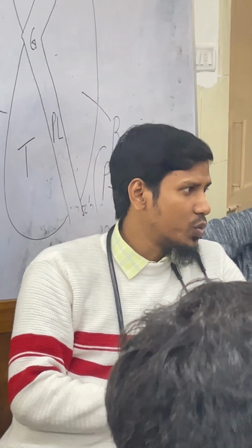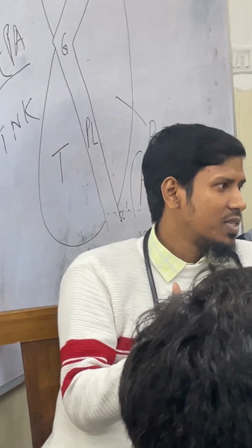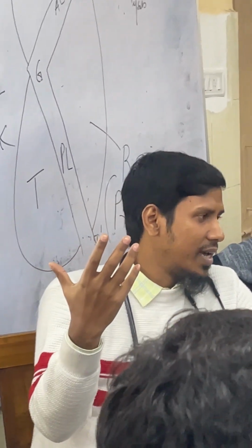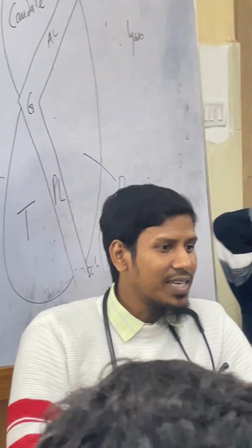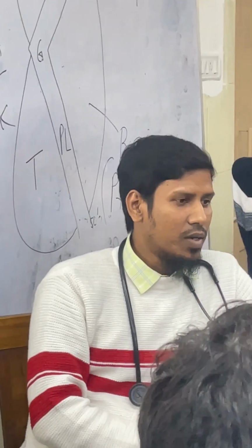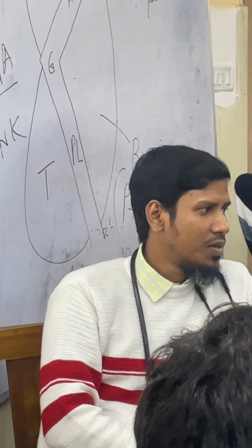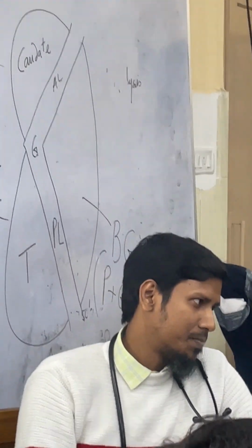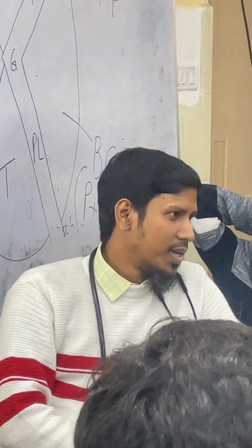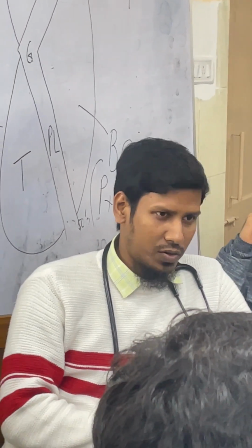and the soft tissues. That means the ribs and all the areas where the soft tissues are lying. Next is the cardiac, that is the heart. Next, the diaphragm. We will look for the diaphragm. Then we will look for whether any effusion is there or not.